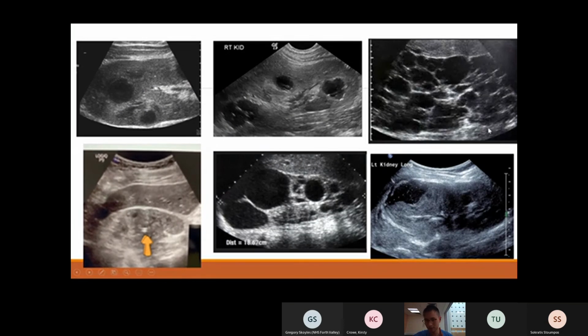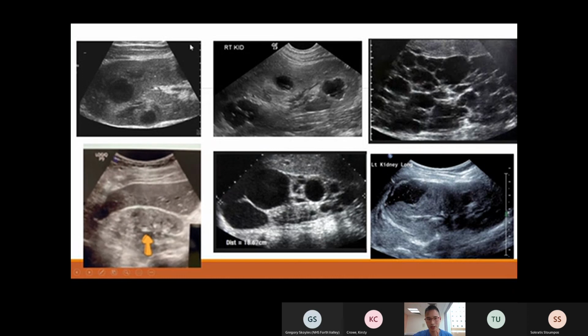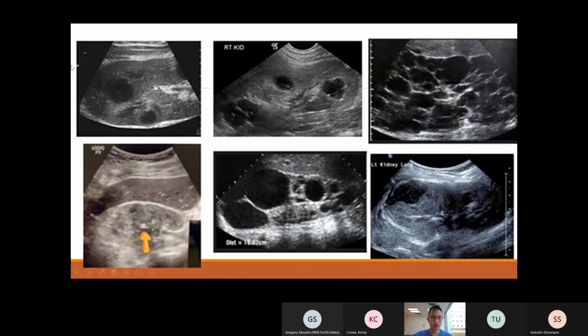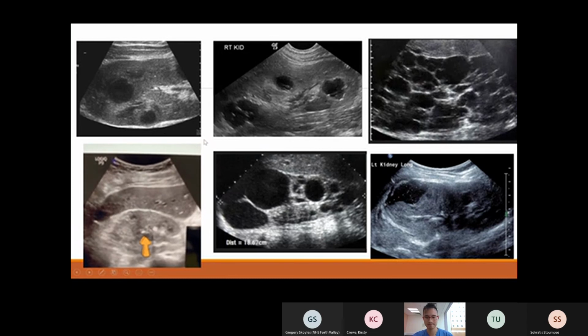And what I have here are some pictures. And I would like some audience participation in these pictures. Can anyone shout out to me what this top left picture, what the abnormality is? Anyone? Who do we have here? Anyone unmute and give it a bash? There aren't that many of us around. I'll give it a go.